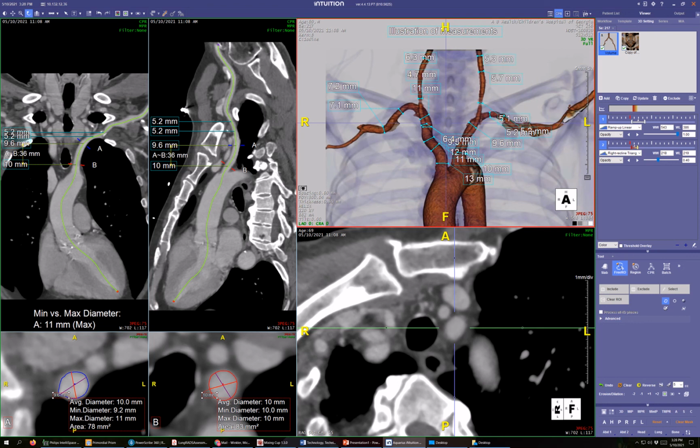It's not good. So that's one of the things I've been, out of necessity, working on here: iterative reconstruction that would be a little bit better. Okay, that one goes there. Something I'd be super interested in working on. Actually, sounds like a really cool kind of thing.